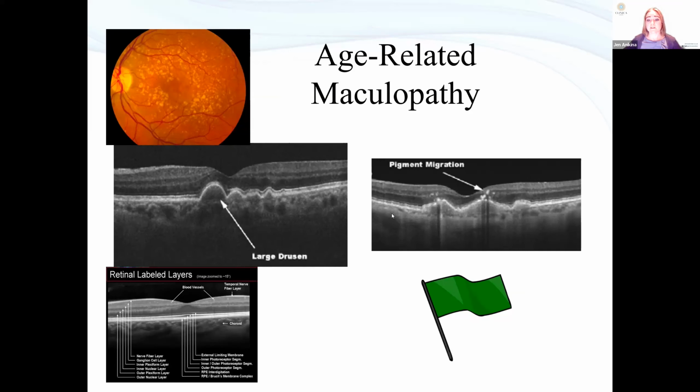Yeah, hyperreflective material in CNV, it is difficult. And this is why we have all the adjuncts which we do in eye clinic, which you don't do, which is the angio-OCT and the fundus fluorescein angiography. We can look at that same picture, and there might not be very much fluid or any at all, but there's this heaped white material, and we think usually it is CNV.